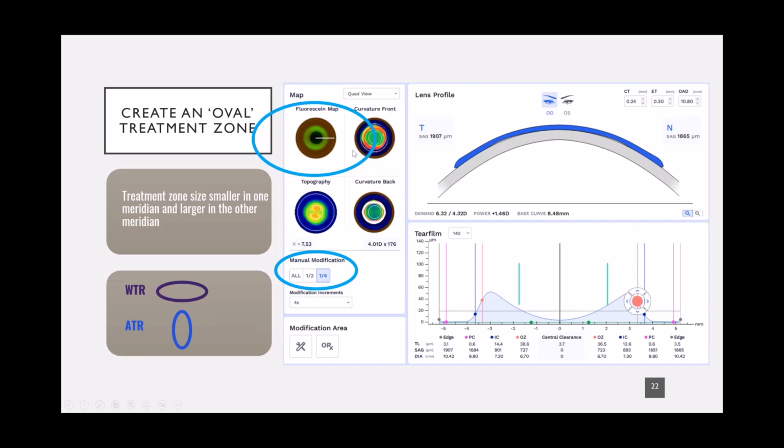So then you want to make that exact same change over here on this side so that it does the temporal. Or instead of having it clicked over here, you can click it over here, and that would make it say temporal over here. Whatever you have selected here is always going to be on the right-hand side of your screen over here.